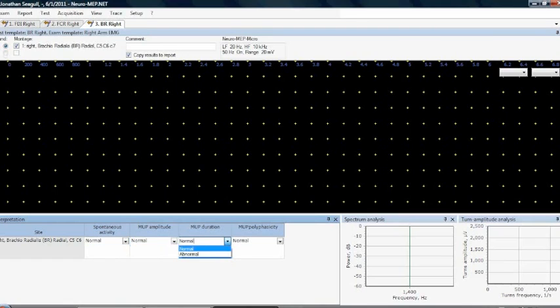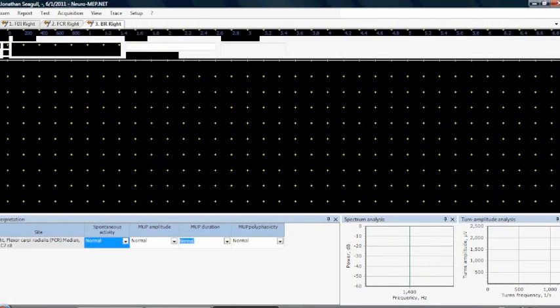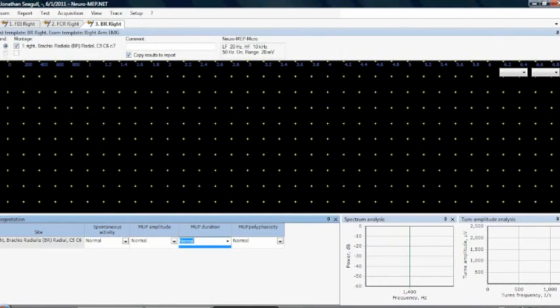It's going to show me all of these things right now. Everything that I change is going to appear in that. So because in the first two I had not implemented it, obviously it doesn't show me that. But now if you close this and reopen it, every single muscle that you're going to do is going to show you the changes that you've seen before, that you have implemented before. And that's how it is.